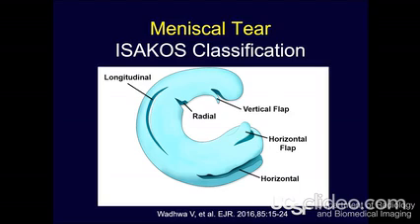Notice the longitudinal tear, often seen with trauma, that propagates along the hoop stresses and the fibers of the meniscus. And it usually goes perpendicular to the tibial plateau, so from top to bottom. And a lot of our peripheral tears, meniscocapsular separation type tears will be these. Next, we have the horizontal tears. They split that meniscus into two, or they go to the superior inferior surface and they are usually degenerative.